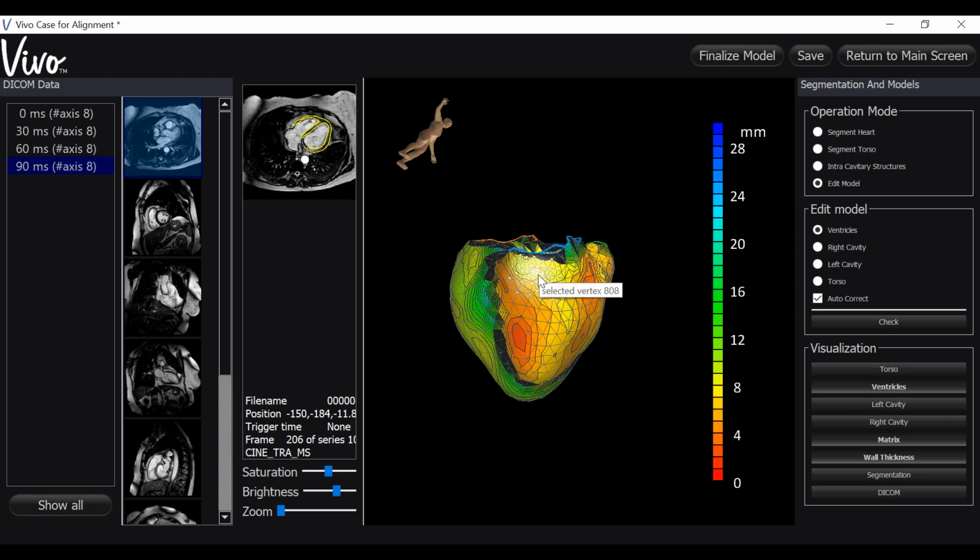Just remember, when rolling your scroll wheel forward or backward, make sure to move only 1 or 2 clicks at a time, because otherwise it can create errors on your model. So small, 1 or 2 clicks backward.